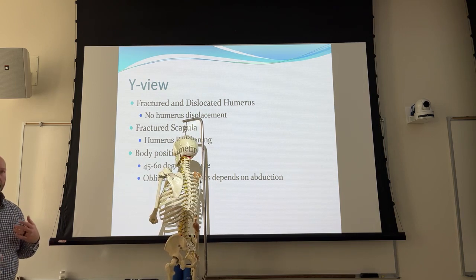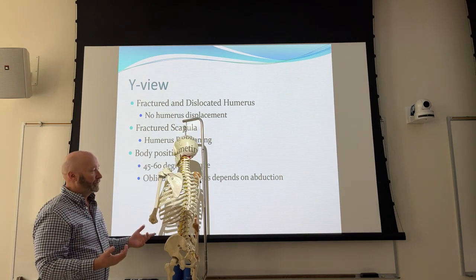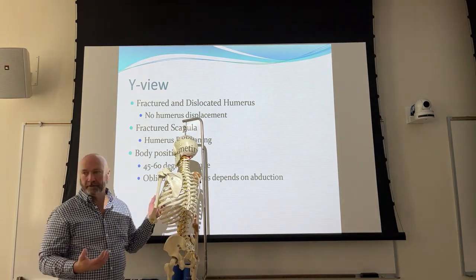Is it for humerus fracture? If it's for humerus fracture, just leave it alone.